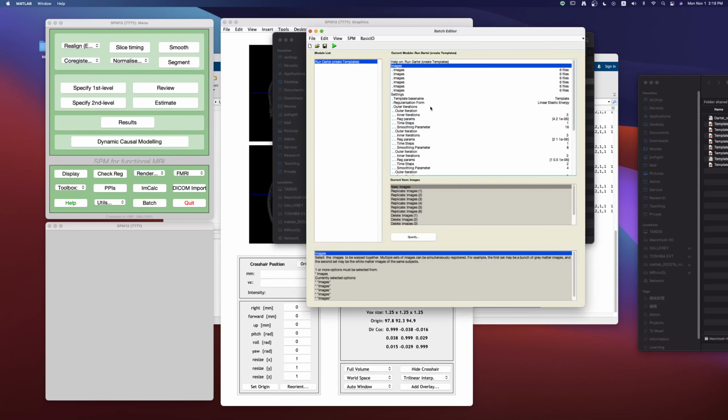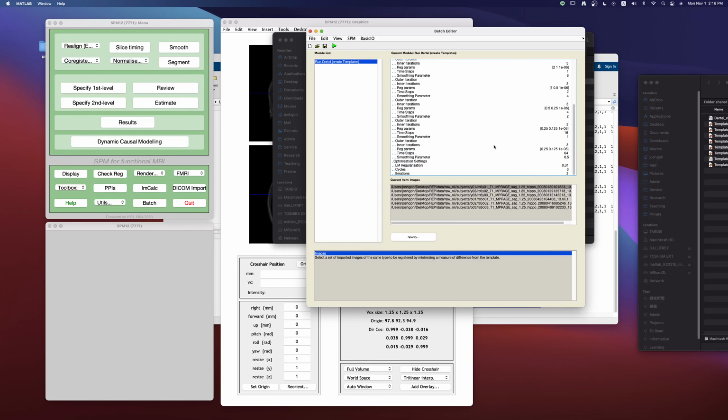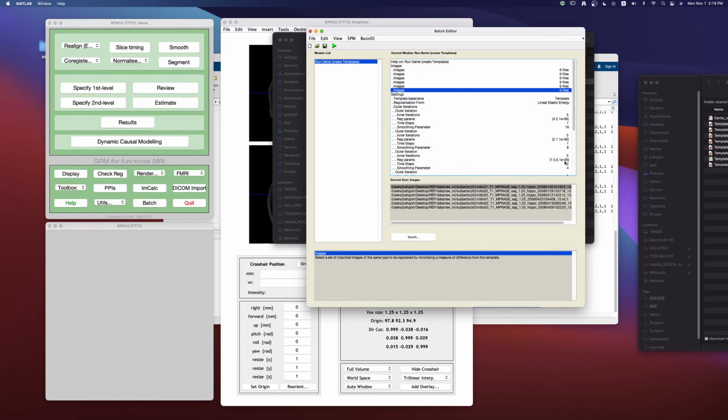And what it is basically is all my image types, the RC files, all preloaded. So just to go through with you, this is RC1, subjects 1 to 3, 003, RC2, RC3, 4, 5, and 6. All this is done, and there's nothing else you need to change for the rest of the settings. These are just different levels of smoothing, which is what Dartel needs to make a study-specific template more and more precise.